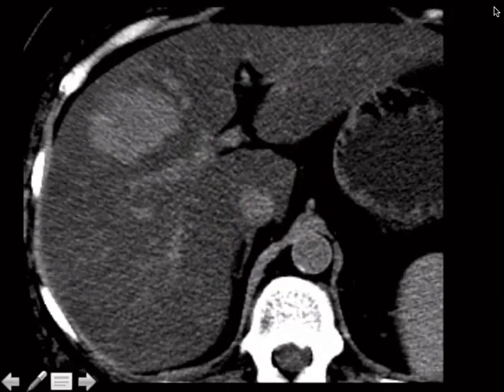Remember, what's the strategy, guys? Deep breath. What's the sequence? What is a target organ or lesion? Looks like this is a non-contrasted study, and this is CT, obviously. And it's through the liver, which is super duper fatty looking, right? And then we've got a bright lesion on a fatty liver. And this is what I was trying to get at with ultrasound, is that you've got a fatty liver or a really heterogeneous liver from whatever, that you're hyperechoic or hypoechoic, that's all relative to your background parenchyma.